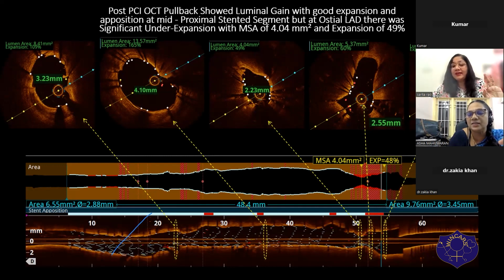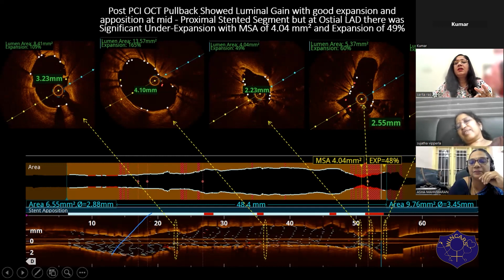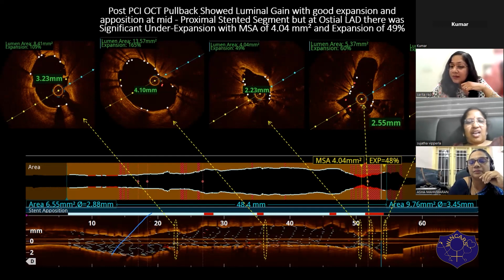The LCX, the circumflex, the struts? Do you have the 3D? No, I don't have the 3D right now. Okay. But yes, Dr. Sujata?